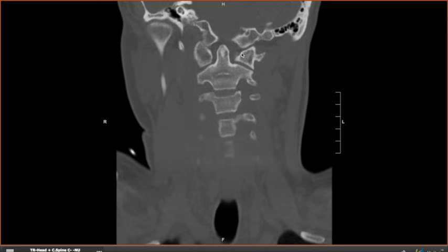Remember their insertion points, because subtle flecks of bone off the anterior medial portion of the occipital condyle or the superior lateral portion of the odontoid process often represent avulsion fractures. As an example, avulsion fractures from the occipital condyles are unstable and shouldn't be missed.